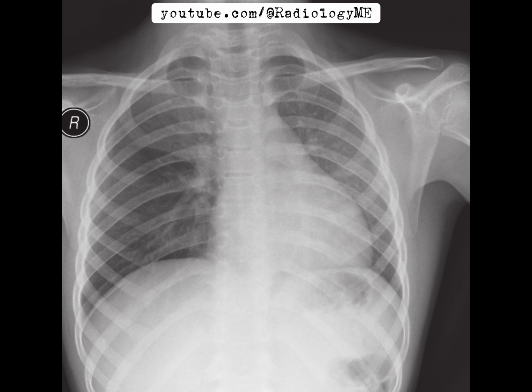Now, when I compare the right lung with the left, I notice that the left lung and right upper lobe are of uniform density, which is what we expect to see in an expiratory radiograph. There's no evidence of volume loss or consolidation. The mediastinal contour looks normal, and the thoracic wall is also normal. The findings suggest partial obstruction of the bronchus intermedius.